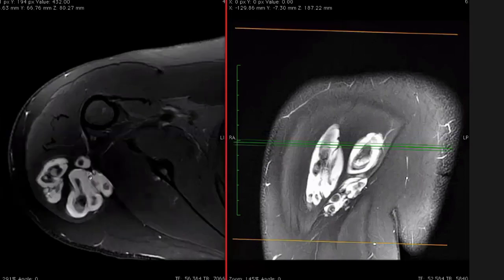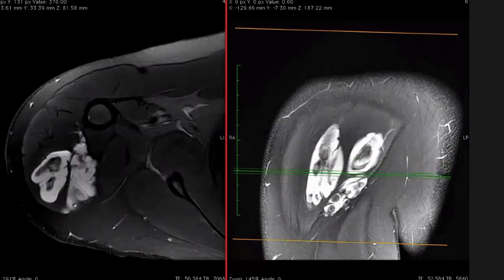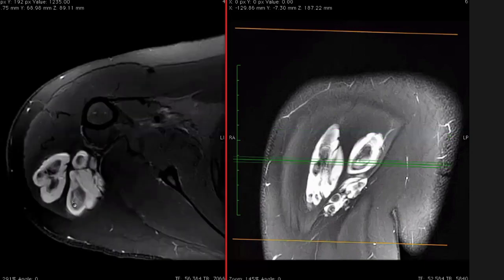Venous malformation, right? These are dilated venous lakes, and these are all what we are seeing. These are thrombi and phleboliths, all right? And don't use the term hemangioma. Hemangioma is a cellular infiltrative tumor in the musculoskeletal system. I know we see hemangiomas in the spine, in the liver, in the spleen, I mean in solid organs, or even in the bone as well. But this is in the muscle, when you see something which is lobular.